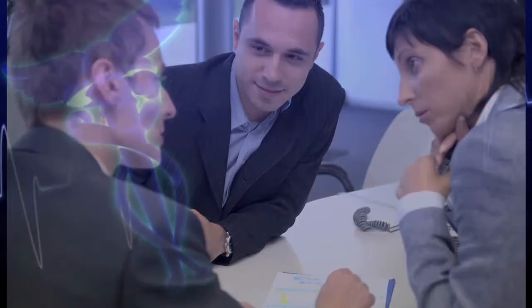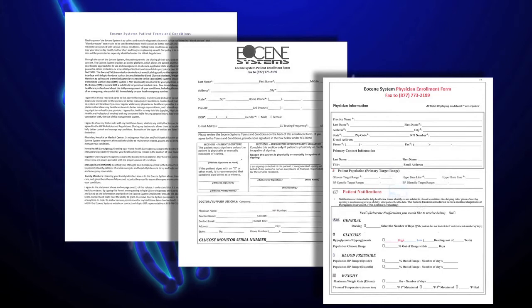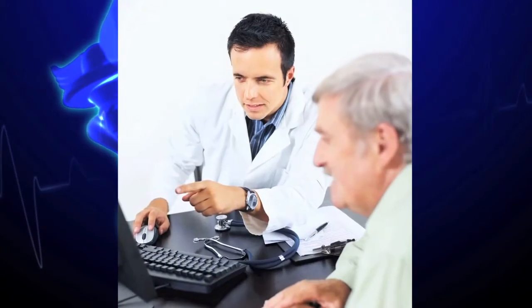Upon your initial setup into the Eocene System, you will have completed your physician enrollment form and will now have your own username and password. Once you start prescribing your patients to utilize the system, they will also complete a similar enrollment form and designate you as their physician. Their test results will then immediately be populated and available to view in your dashboard.